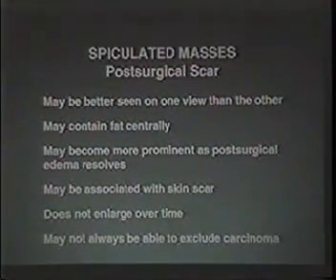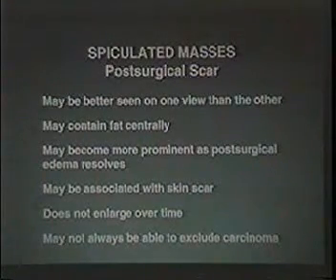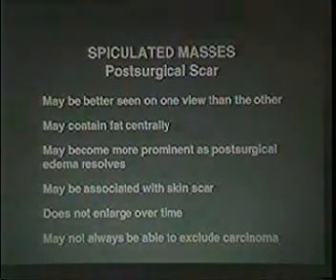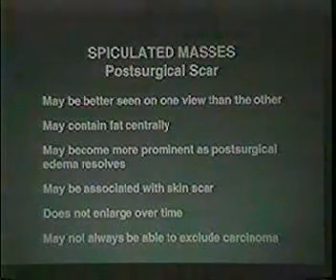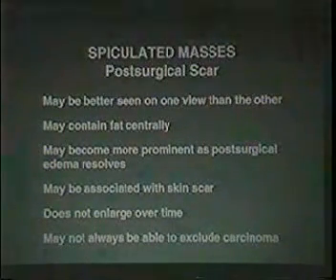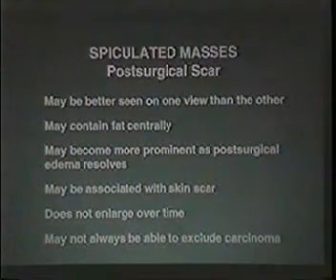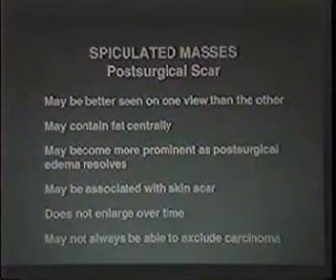And post-surgical scars may be better seen on one view than on the other view. They may contain fat centrally. They may be more prominent as post-surgical edema resolves if you're following them after the acute post-surgical period. They may be associated with the deformity and scarring in the skin that's due to the surgery. They do not enlarge with time, and you may not always be certain that it is a scar that you're looking at, and if you're not certain, then you can't exclude a carcinoma.